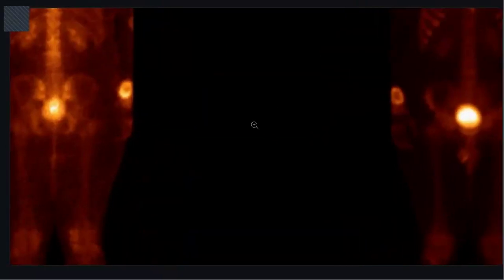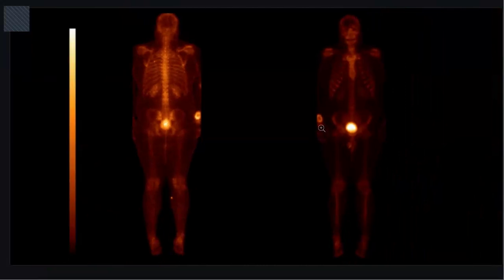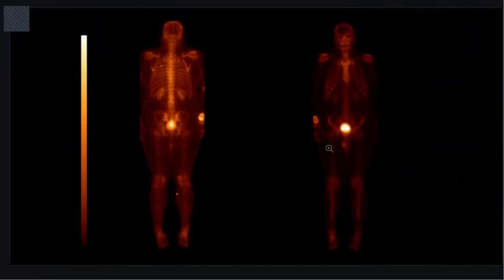What is the character of this uptake? It is a highly intense uptake, and it is homogeneous. I will also see the blood pool phase. Can you see the center and the periphery? There is reduced uptake in the center and high uptake on the periphery.